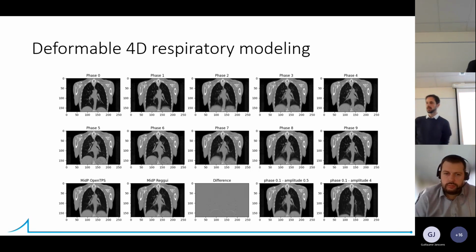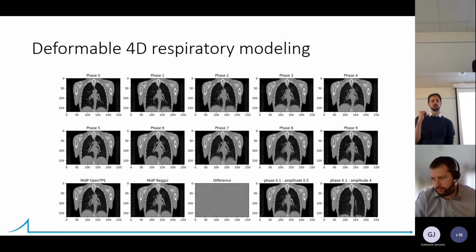First, there is a registration tab, so you can indeed access the registration, and then for the last part of the respiratory modeling, you can also convert a 4D CT. So if you have a 4D CT from the interface, you can create this 3D dynamic model.